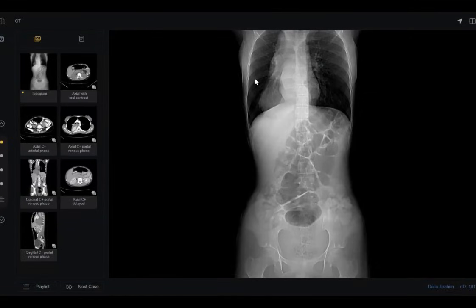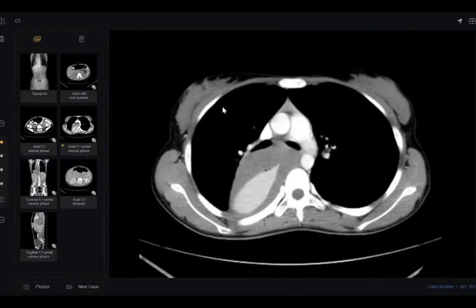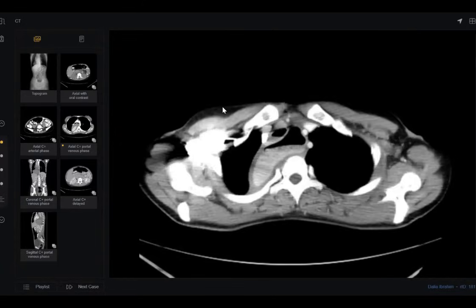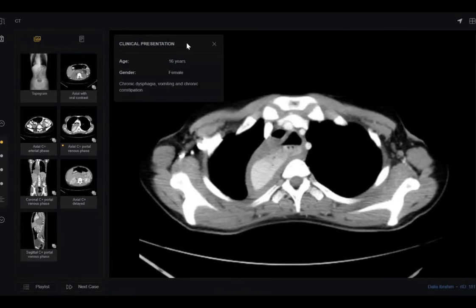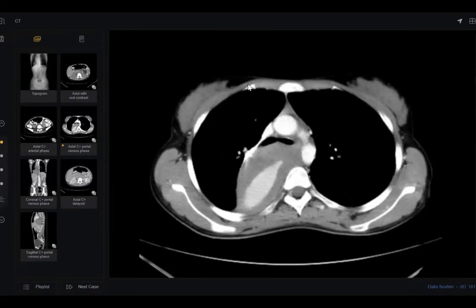You picked up this lesion here very well, and you put your logical differential diagnosis, but you came here and struggled many times. Yes, there is achalasia, but this is a very atypical case of achalasia. Achalasia means dilatation, either primary or secondary. This is secondary, even though the patient is 16 years old, and it is secondary to a benign tumor.